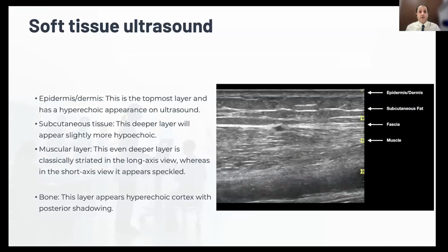So we discussed the importance of POCUS, and how we may miss atypical cases or early stages of some important infections if we don't use it. And then we will discuss how to set up the device, our machine, which probe we should use, and what the best probe is. It depends on the anatomical location of the body and different body habitus. We also talked about depth, focus, and gain, so we need to adjust all of them to have better images.